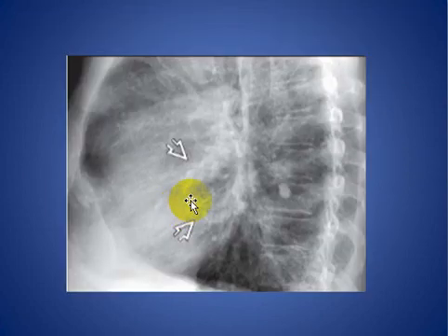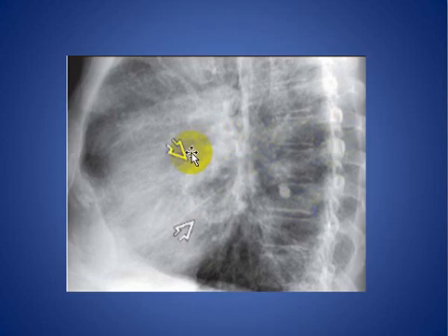And here, this patient on lateral chest X-ray has curvilinear calcification involving the left atrium in a patient with left atrial myxoma.